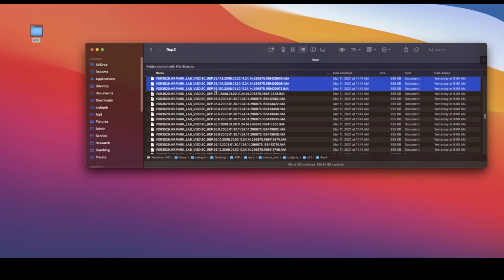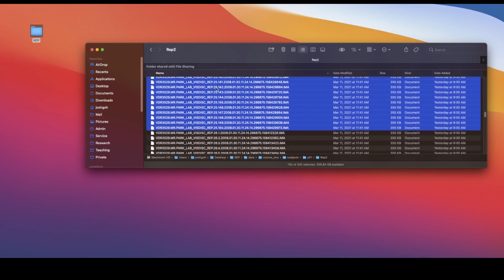150 of the rep.25 series, and we will ignore rep.26. All right. Now we will do this for all subjects. So in Y01, this is the sequence number. Rep23 and rep.25 are the sequence IDs. These numbers are not always the same across subjects.